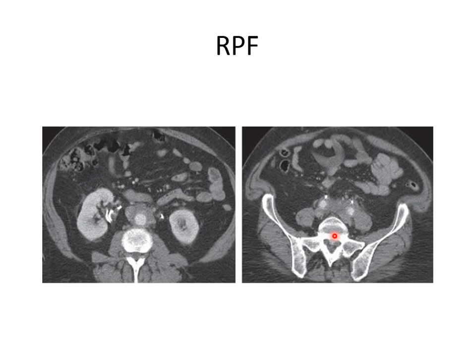What kind of mass effect to the ureter? Pressure effect. Obstruction? Yes. It pushes it laterally, just displacement. No, just displacement.